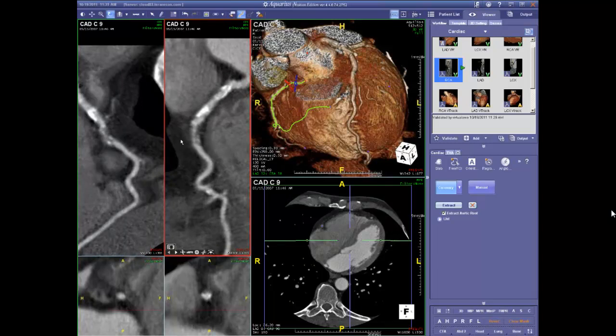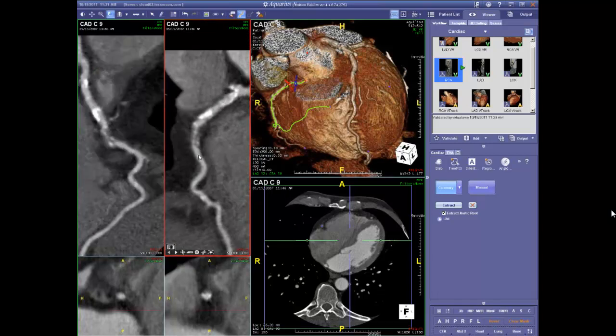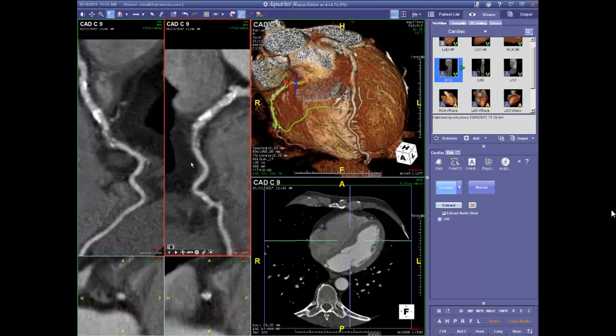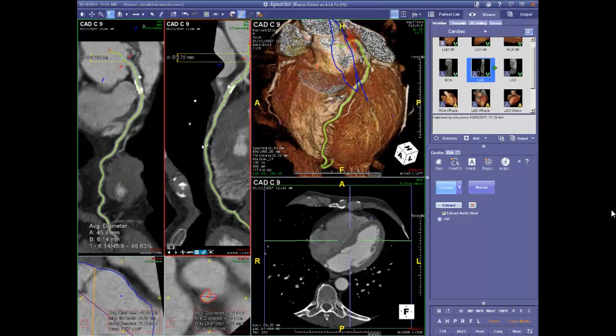And how significantly? This could be moderate to severe. And so I would want to reflect the high likelihood that a lesion like this could easily cause a positive stress test or ischemia-related symptoms. In practice, I must be honest, I was so busy getting ready to go to the next lesion that I didn't appreciate this. So we certainly have proximal dominant right coronary artery disease, which is likely to be obstructive, and also very likely to have been involved in what might have been an unrecognized acute coronary syndrome. Let's look at the LAD, because that's my recollection of where so much of this disease was before, that I wanted to illustrate with this case.